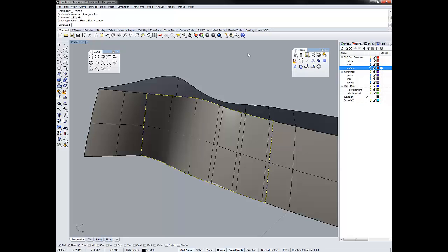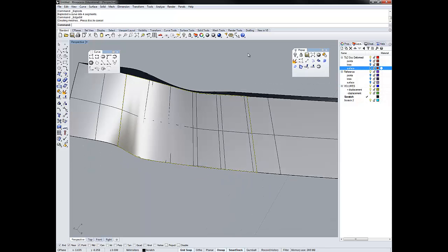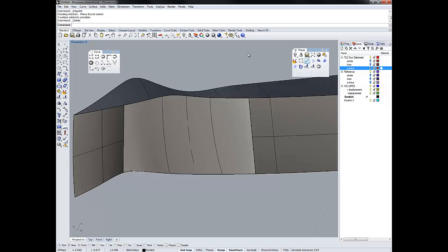You can see this discoloration means that the 2 surfaces, this one and this one, are overlapping, which is not what we want. So I'm gonna try and deal with this region here first. So I'm going to delete this surface. I'm going to draw a line between here and here. And these aren't arbitrary. Notice that the curvature changes here. So I'm trying to catch it right before the curvature. And then I'm going to split that line at this point. Split. Okay, successfully split into 4 pieces.